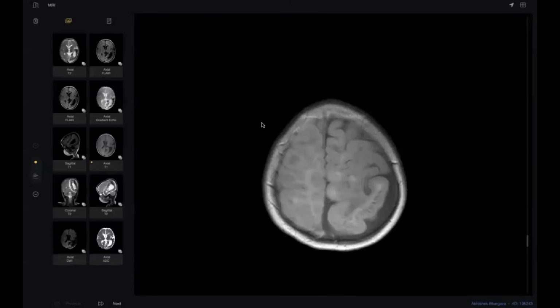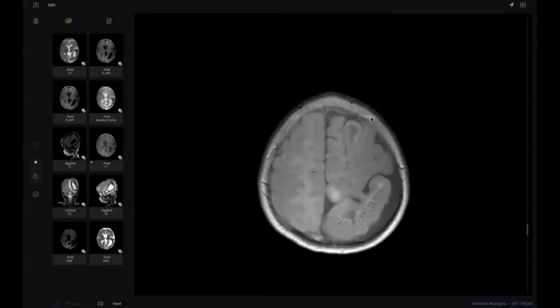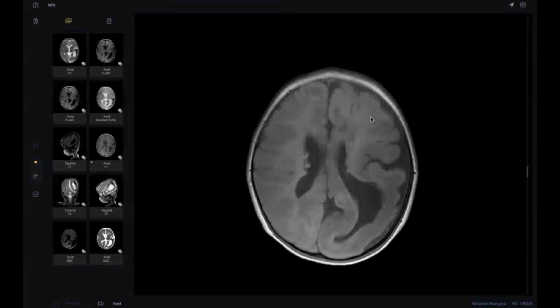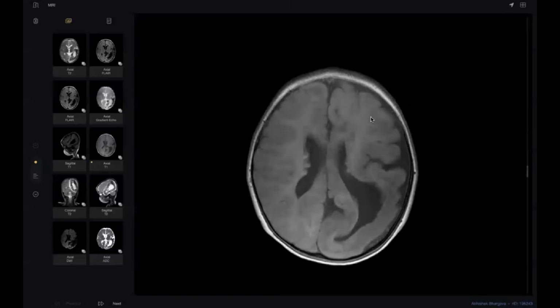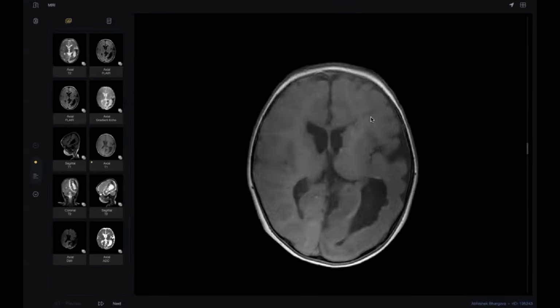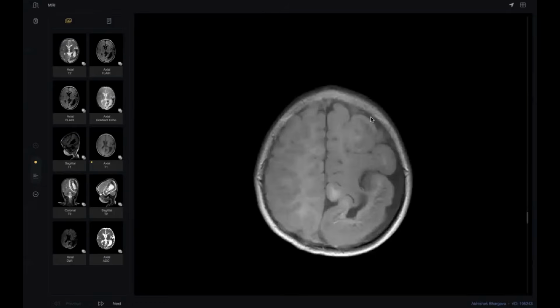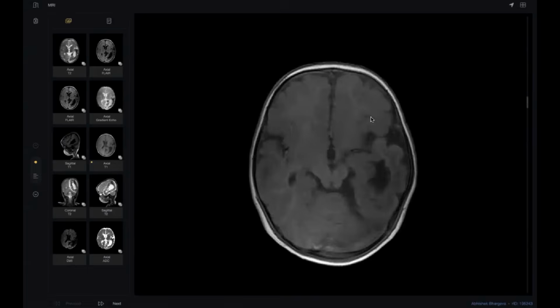Sir, may I please know the age of the patient and if any history is available? Okay, 40-year-old male patient presented with psychological disorder. So I've been presented with multiplanar, multisequential MRI of a 40-year-old male patient demonstrating significant deformation of the left cerebral parenchyma, where there's paucity of the gyri, that is pachygyria, with ipsilateral dilatation of the left occipital horn associated with periventricular FLAIR white matter hyperintensities likely representing gliosis.